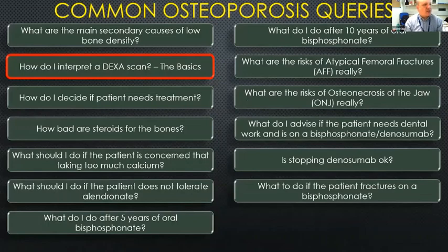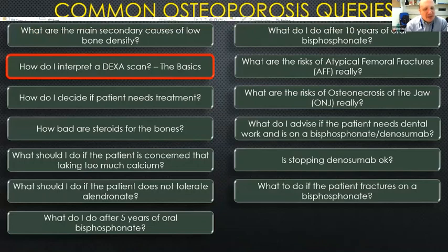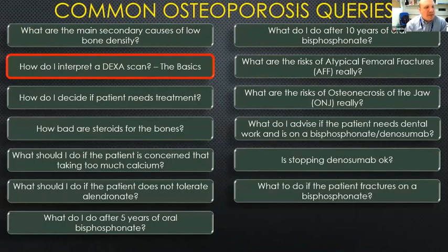Okay, so the next topic is how to interpret a DEXA scan. So this may be quite simple for some of you, and it may be not so simple or useful for some other people as well. So I'll do it from the basics just so that you fully understand it.